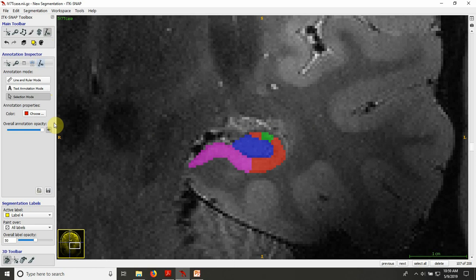So again, the first line that I'm drawing, starting at the most superior place of the hippocampus, and if there are multiple voxels, I'm gonna go in the middle, and then go to the most medial point of the dentate gyrus, touching the subiculum, like this. Then the second line actually follows again the dark band next to the first portion of the subiculum. And then the third line again starts at the midpoint of this first line and is parallel to this second line.